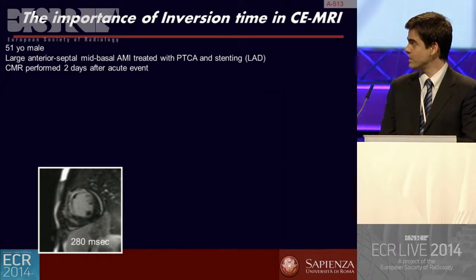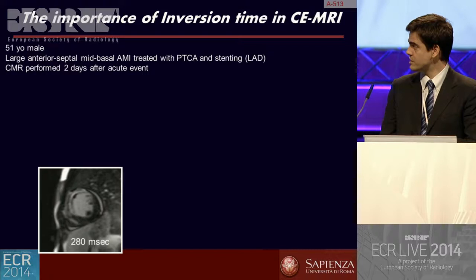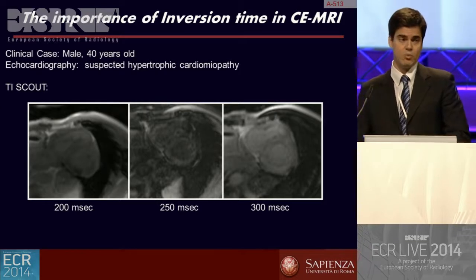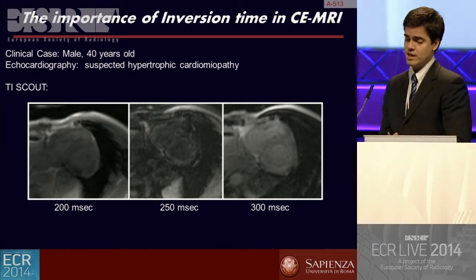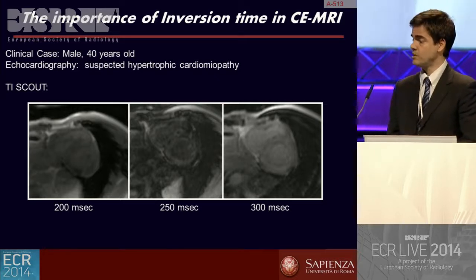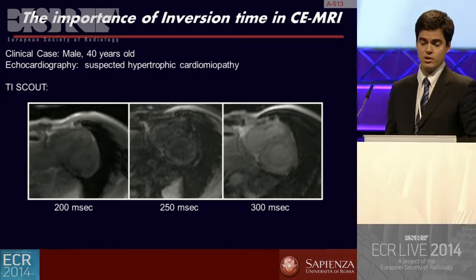I would choose 280 milliseconds, because you see the lesion, the infarcted, like in this 51-year-old male with infarction of the LAD, shows homogeneously high signal intensity, transmurally spread with some microvascular obstruction. So the problem is inversion time. We have to carefully focus on inversion time. Today, Look-Locker sequences exist, allowing to modulate inversion time and to select from a series of numbers.